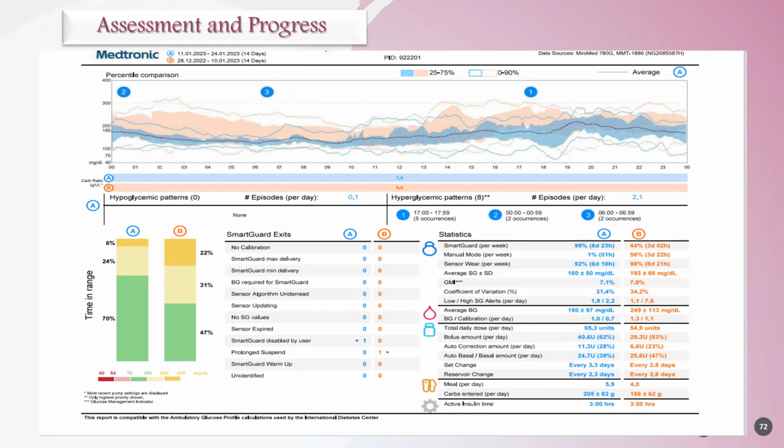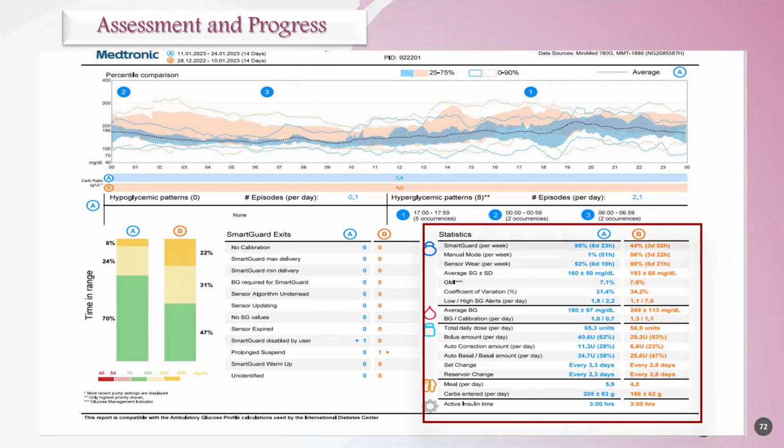Okay. And then you can see the graphs now. Nothing is wrong regarding how you read the report, whether you start from up, right, or left, but with your experience you will find your way, though the basics are the same. Some doctors start with the statistics first, which is very nice to look at. Others start with the AGP report first. So nothing is wrong. You will find your own way when you become more professional with time.